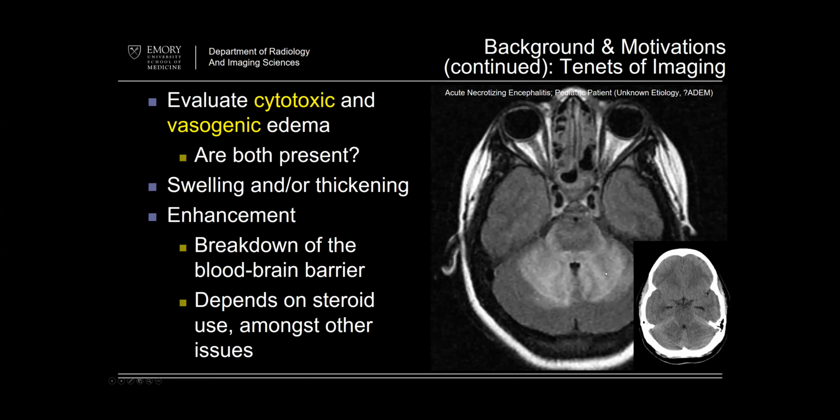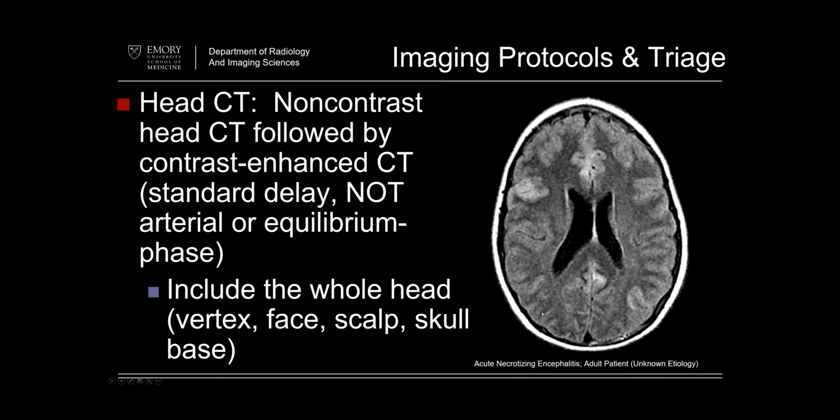Patient with acute necrotizing encephalitis, and very hard to see on the CT, but you can see a little bit of decreased density, a little swelling. And this, of course, is getting into the posterior fossa. Once you get into the cerebellum, you start to worry about cerebellitis too.